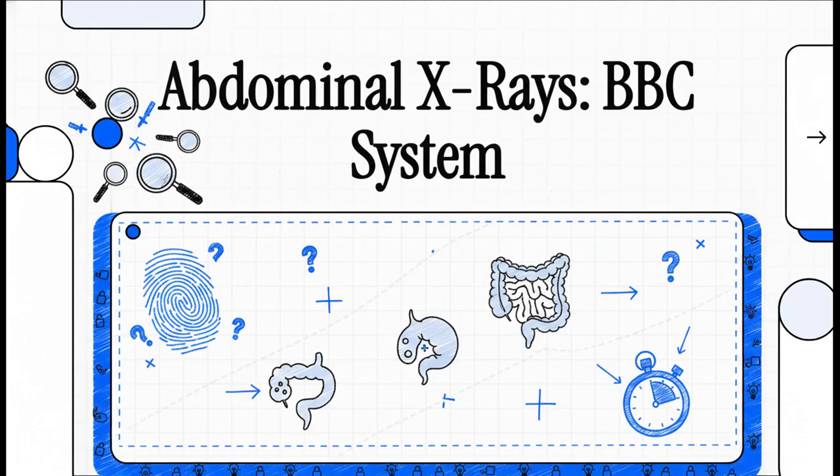While CT scans are obviously the gold standard these days, plain films remain an incredibly rapid, first-line tool for evaluating things like bowel obstructions, toxic megacolon, and suspected viscus perforations. So today, we are going to master the BBC framework, also known as the Abdo X system. We're going to use this systematic framework to sweep the crime scene of an abdominal X-ray, uncover life-saving clues, and ensure you never miss subtle or life-threatening pathology again.